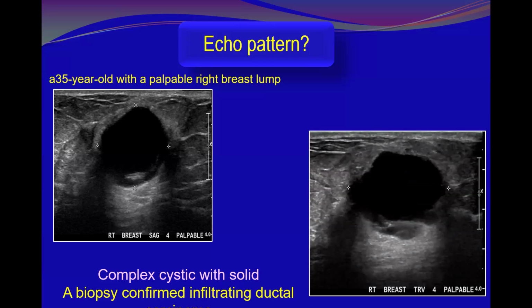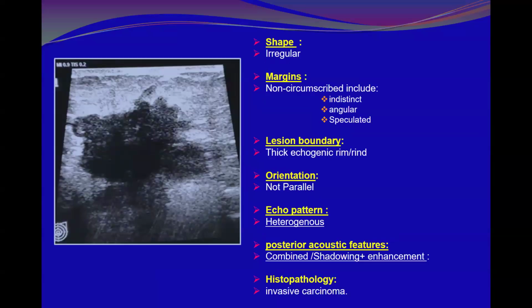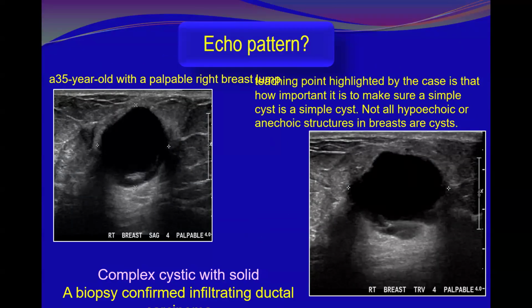Okay, what about this one? Complex. Excellent, it's also complex. There is here a septum, and there is some material seen here. And look at the margins. Okay, that was also suspicious, was also cancer. Both are cancer.